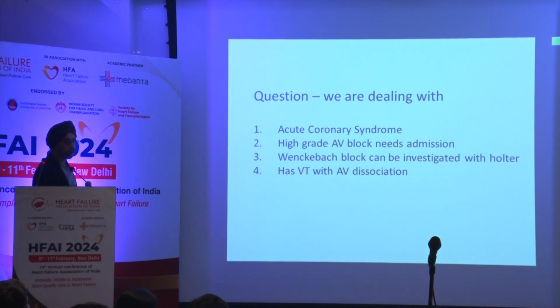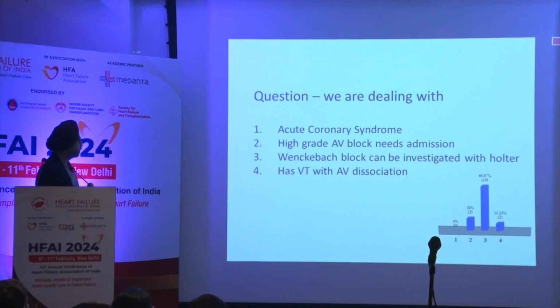First is, it's an acute coronary syndrome. We need to do an angio. It's a high-grade AV block. It needs admission. It's a Wenckebach and can be investigated with a Holter. Has VT with AV dissociation.